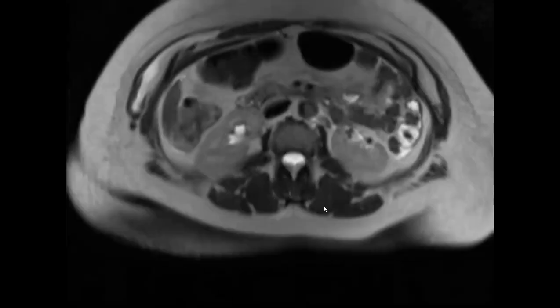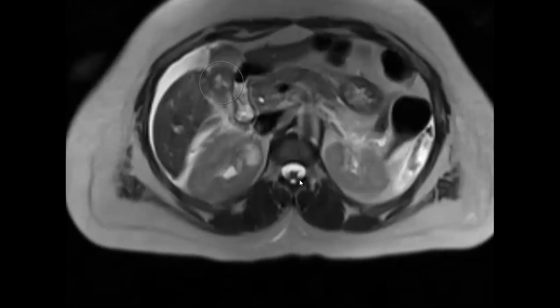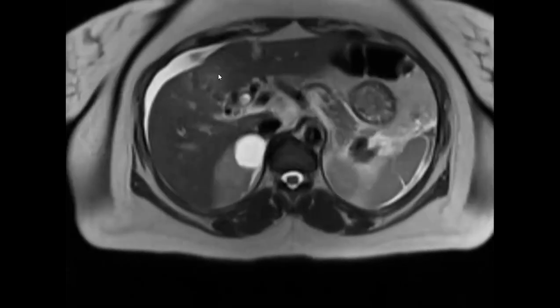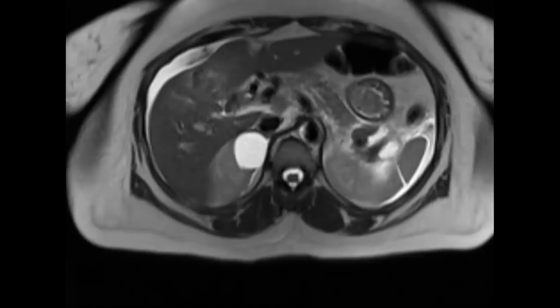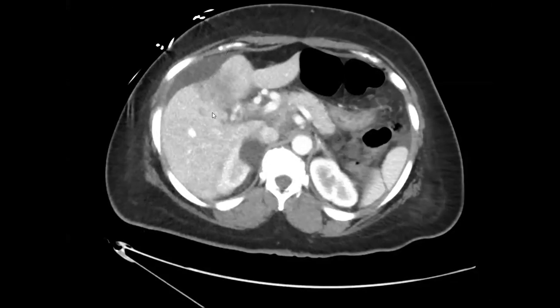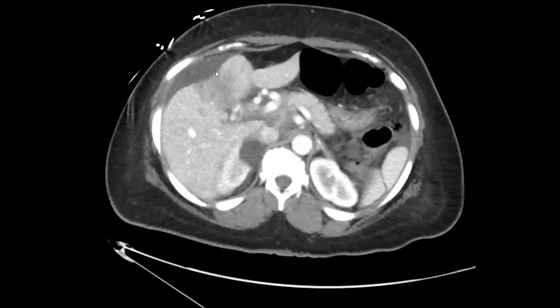Where is it coming from? The liver stuff? Cancer. Yeah. Also, the GB was cancer. Yes. Cholangio, yep. So I want to show you the CT again. Let me just pull back the CT. So you said capsular retraction and then kind of let it go. But if this was just perfusional stuff related to an aborted cholecystectomy, oh no, this is not bueno. It should not have capsular retraction, right? It looks like cholangio. You were saying even infiltrative and all that stuff.